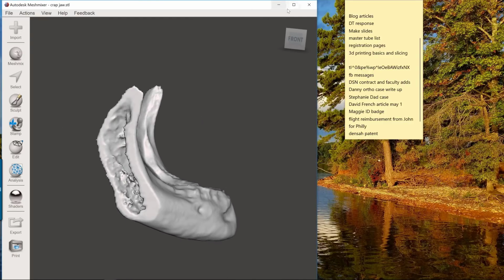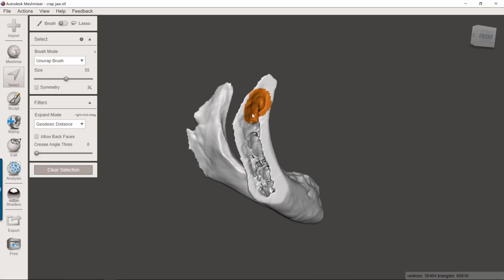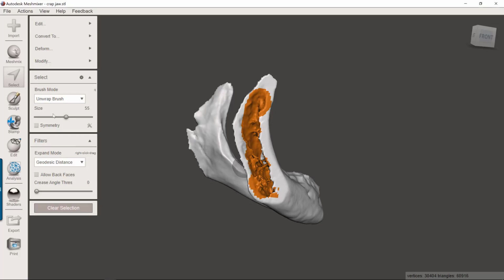Let's see if now, just sometimes this is finicky and it just wouldn't let you do it. Now, for whatever reason, I can select all this. There we go. I'm going to get all this external border. Let's delete.